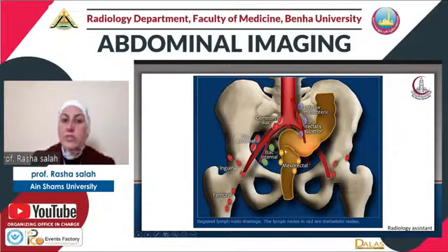So the regional lymph nodes are only at the mesorectum, the superior rectal, inferior mesenteric group, or the internal iliac and obturator lymph nodes only. Other lymph nodes are considered distant metastatic lymph nodes, or M stage.